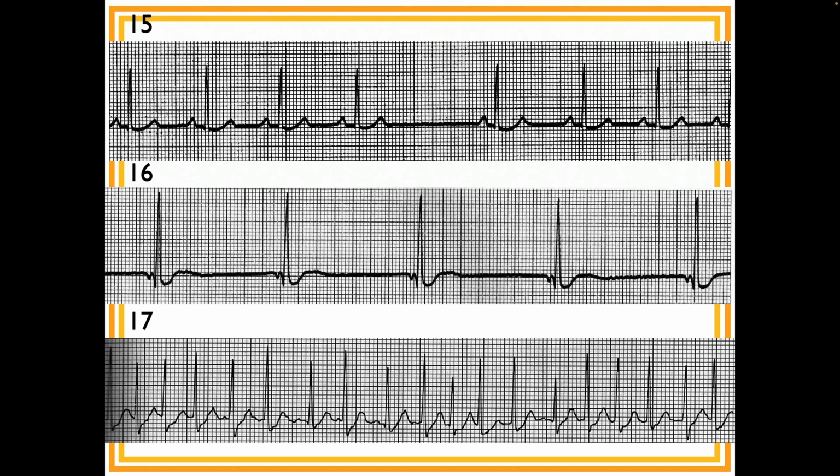The problem here is that based on the ECG, I really can't tell whether it's AFib or MAT, but AFib is so much more likely that you really need the clinical history of the patient to be able to rule in MAT. So you will not have MAT on any of my tests unless I tell you that's what it is.